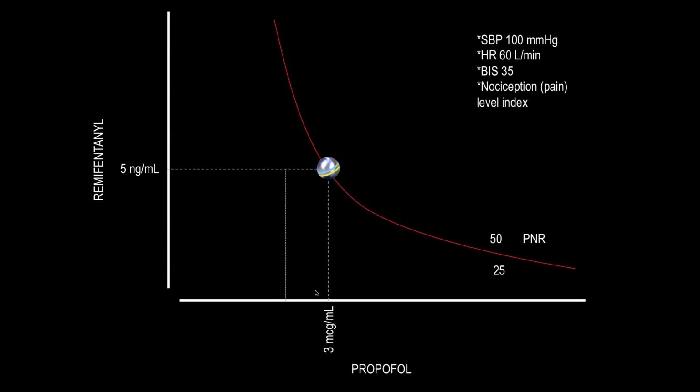If we have a TCI system, this will only allow the concentration of propofol to be adjusted, in this case by the bispectral index data. It would be necessary to decrease it. If we have a system that can estimate at which point of the curve the interaction is, after lowering the concentration of propofol without modifying the concentration of remifentanil, we would see how the probability curve where the patient was changed. This can mean that the anesthetic plane was modified by changing the probability curve of non-response.